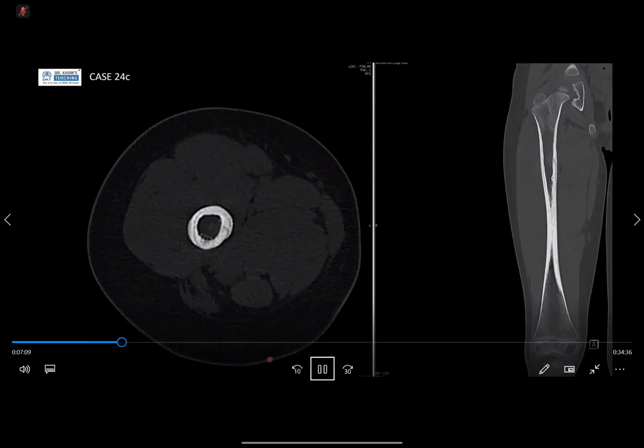Would osteopetrosis just affect a single bone in a single site? It's systemic, multisystem. Think about one of the differentials you mentioned earlier. And remember, it probably took some delay because the clinicians didn't want an urgent CT scan. They said do it when next available. So you've got some time in between the MR and the CT, maybe a week or 2 weeks. So there is a tract communicating to the superficial tissues. So this could be osteomyelitis.